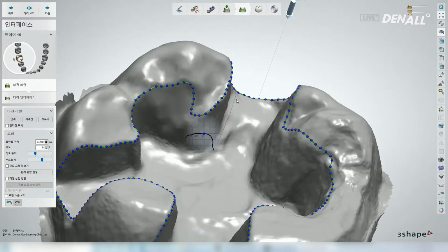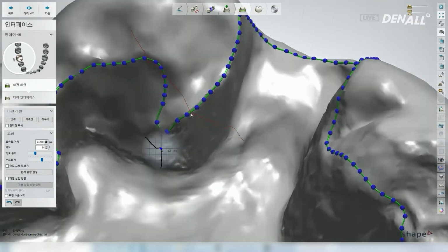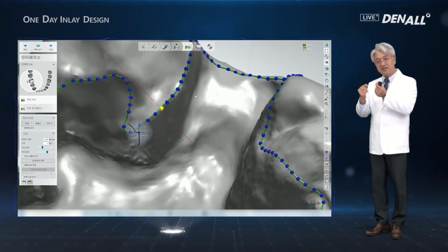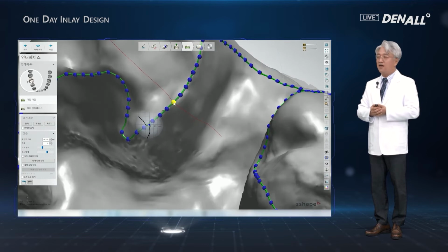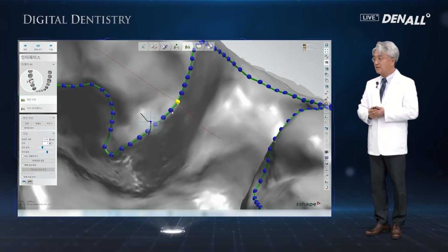And this border area, the inlay borders are like knife edge, very thin, but can be printed with the 3D printer. But in milling, if you cut, it can break because it's thin. So you have to take that into consideration in prep to have good inlay results.